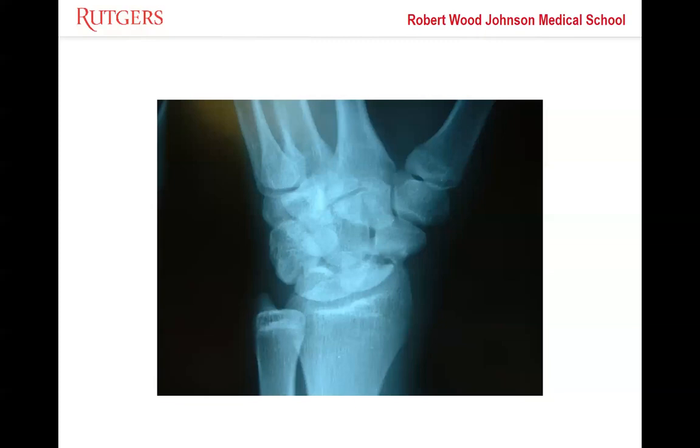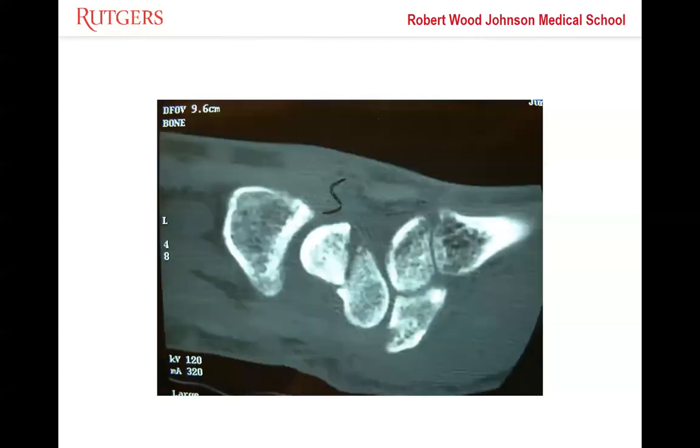All right, Dan, do you want additional imaging here? Okay. So we got a CAT scan. And this is a lateral view with the fingers being on the right side. What do you think? Is this displaced? Okay. So I think this is, and it's probably hard because I have it rotated, but this is the humpback deformity. This is where that distal piece goes into flexion.